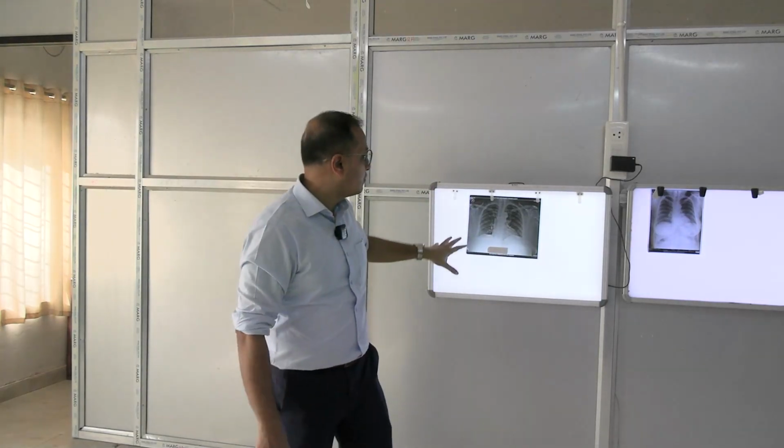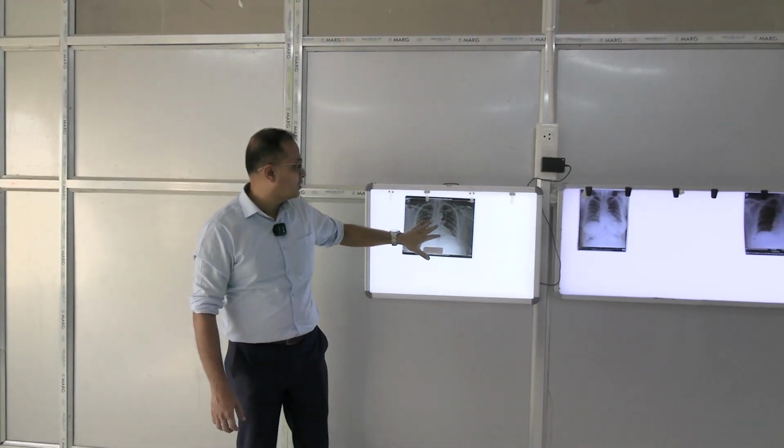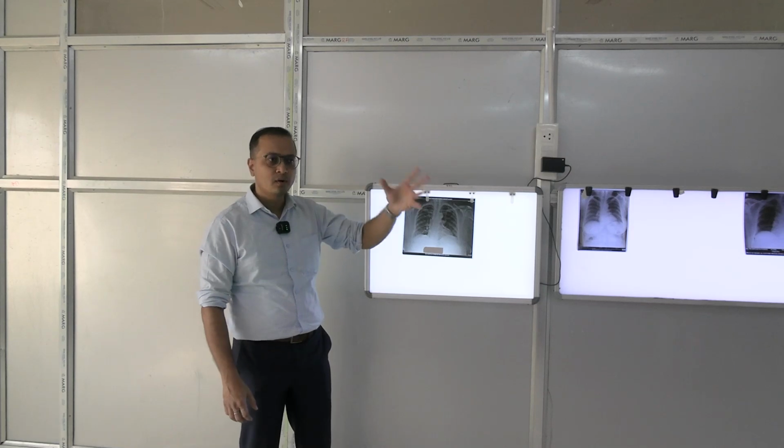So its shadow is something in between the ivory white of bone and the black shadow of the lung. It is a gray-white shadow, partially penetrated, taken as the silhouette of the cardiac structures. So these three shadows will come to you in shadow interpretation. This is how we identify lung shadows in the diagram picture, based on the views.